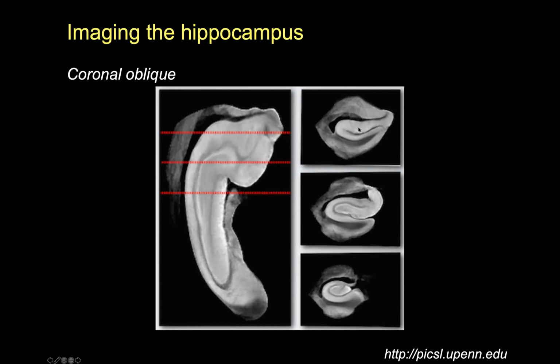And also there's a transition from the head of the hippocampus into the amygdala, which has a little bit of a more amorphous sort of quality to it in terms of how it looks on a scan. It's more of just a blob instead of the nice structure that we see here. So if we went any more anterior here, we would probably start to get into the amygdala.